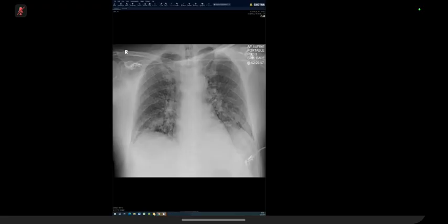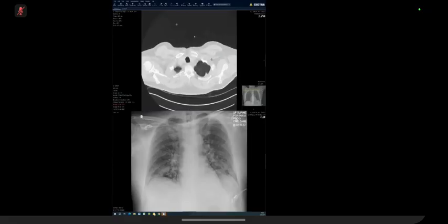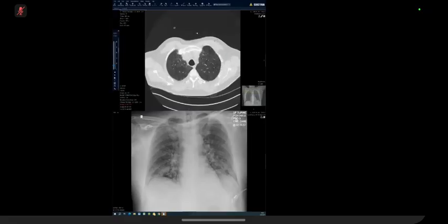So this could represent a fungal infection, so Pneumocystis pneumonia. This could be miliary tuberculosis in an immunocompromised patient. What do you want to do next? I would like to do a sputum AFB culture to confirm my findings. I don't have a sputum. I will also do an HRCT of the thorax.